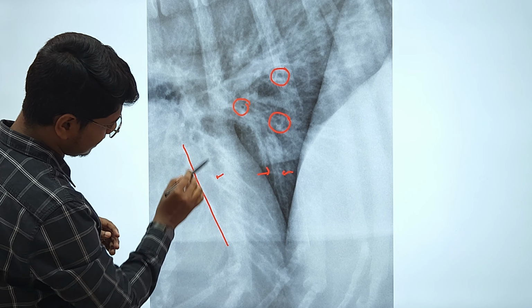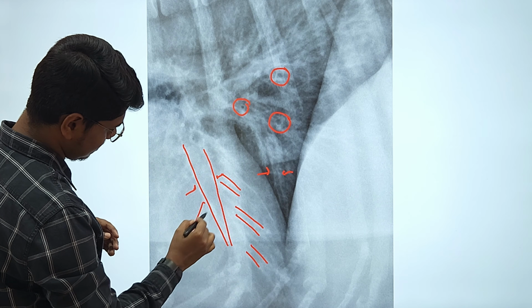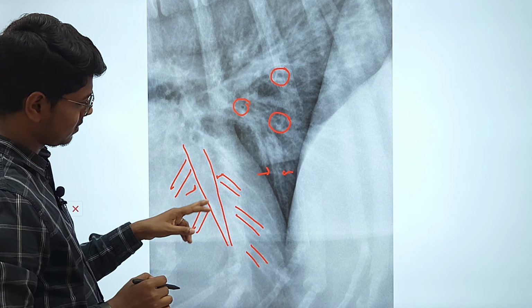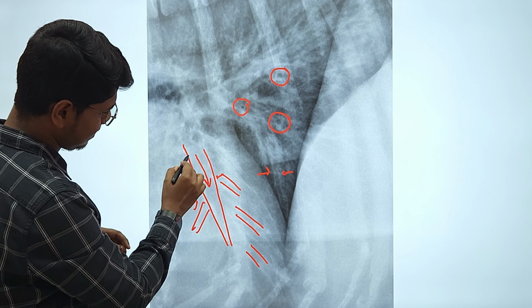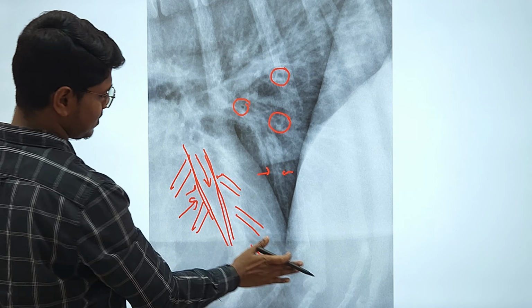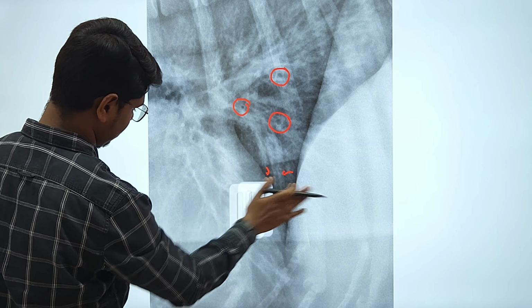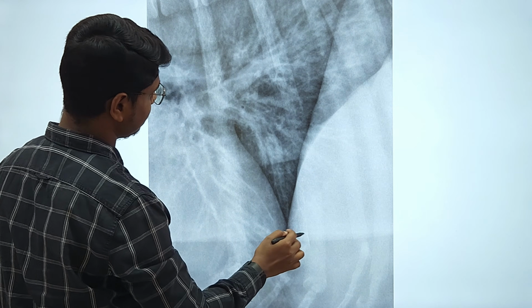Okay, this is the main tram line from which different tram lines are originating. This is tram lines. It contains middle air, side is air, and you have a soft tissue opacity of walls. So this is basically the bronchial pattern. The bronchial pattern. Let us see another radiograph.